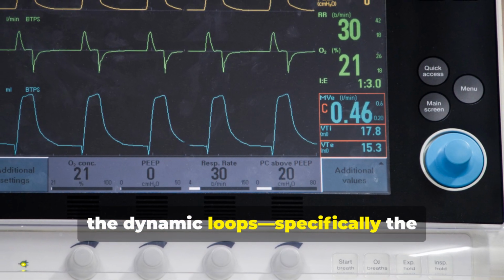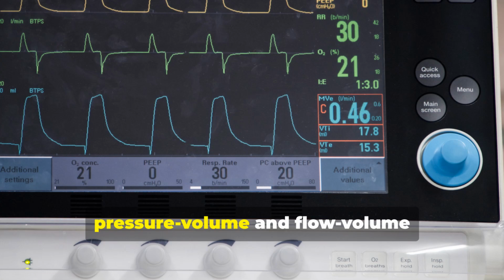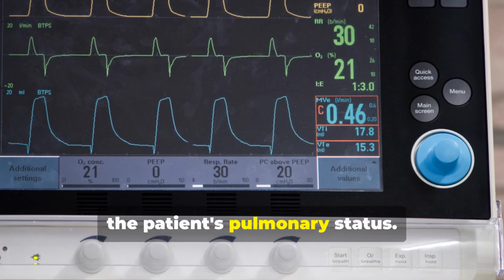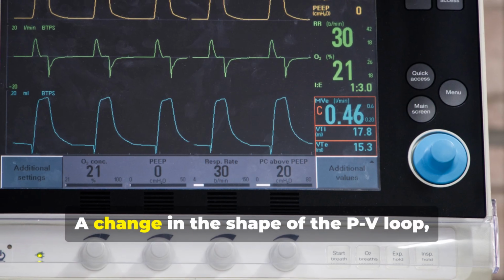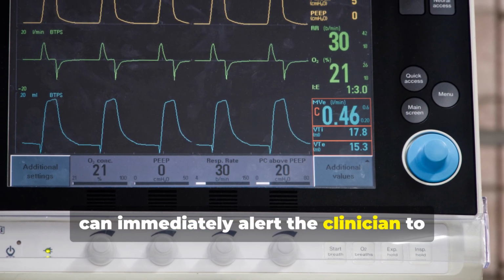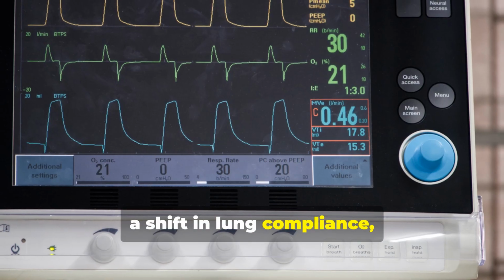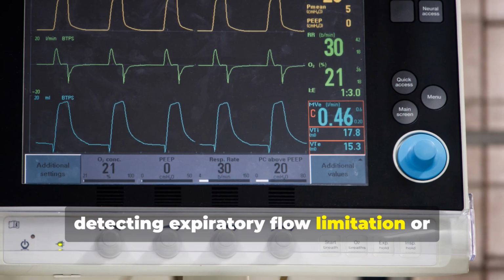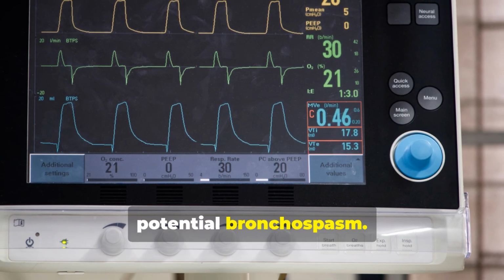Simultaneously, the dynamic loops, specifically the pressure volume and flow volume loops, provide a graphical signature of the patient's pulmonary status. A change in the shape of the PV loop, for instance, can immediately alert the clinician to a shift in lung compliance, while the FV loop is invaluable for detecting expiratory flow limitation or potential bronchospasm.